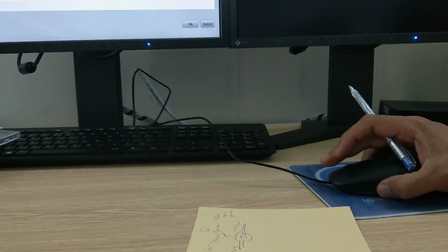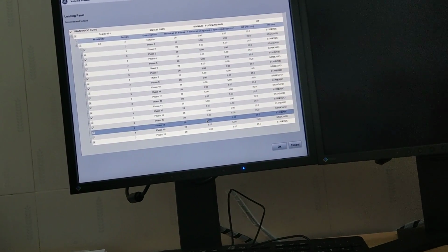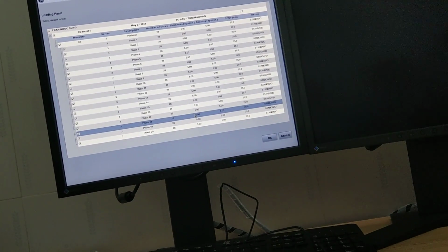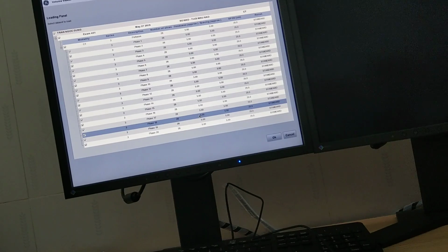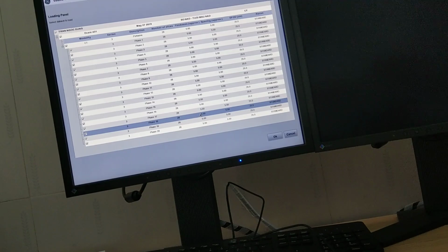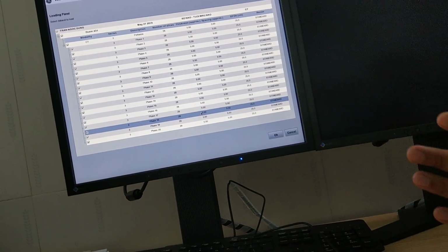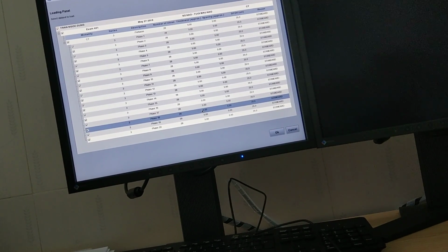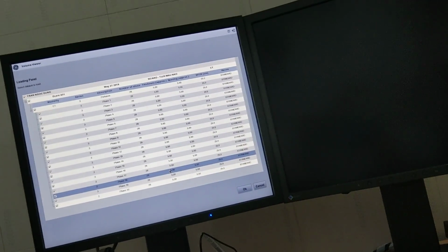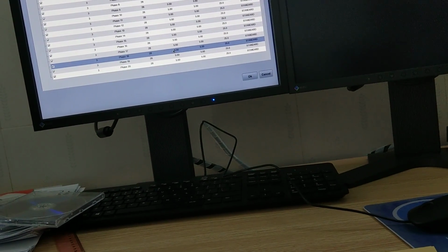You only need 5. Okay. In perfusion, we don't use small, thin slices. If we use thin, there is a lot of data, probably 100, 200 images. So we don't want that. 5 is okay. What is important in perfusion is the temporal resolution. The scan time must be less than 3 seconds. One image must be 3 seconds maximum. More than 3 seconds, not accurate. Okay. So the protocol has been set. Your machine's fastest rotation is 0.28, which is very fast, but we don't use that. We use 1 second, which is okay.